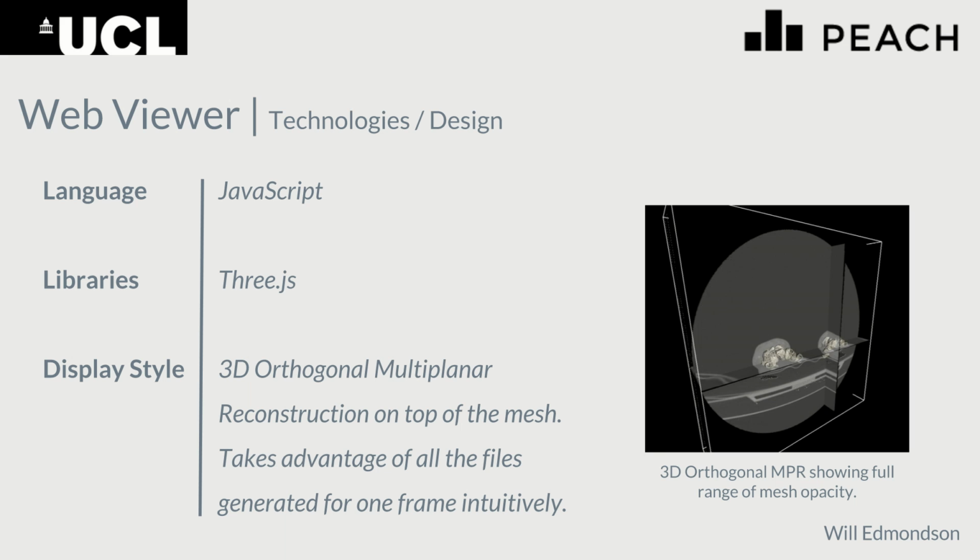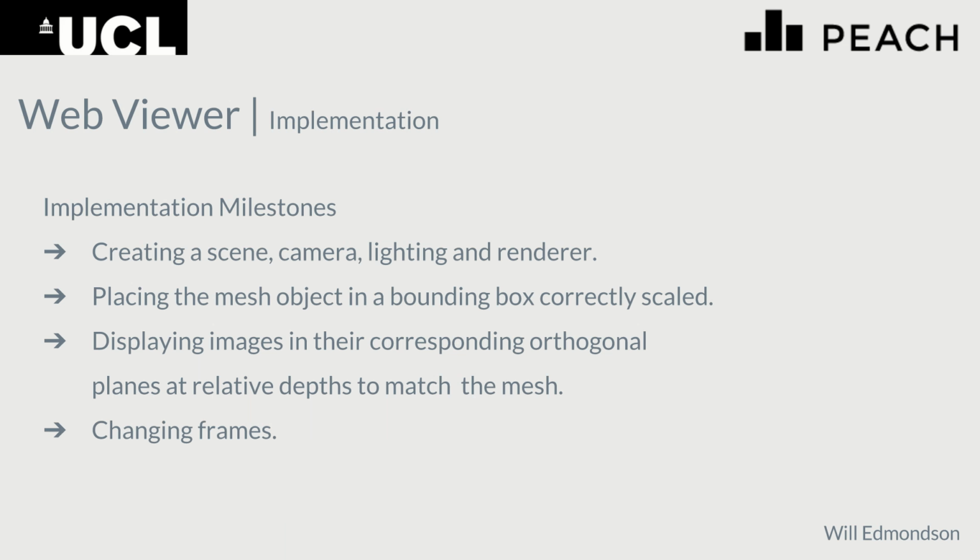The display style is slightly different from that of the HoloLens. It's 3D orthogonal multiplanar reconstruction. This shows the DICOM images above the produced mesh and takes advantage of all the files generated during the preprocessing section of the pipeline. A few implementation milestones: creating a scene, camera, and lighting to render the mesh objects within a bounding box, displaying the images in their corresponding orthogonal planes relative to the depth of the mesh, and then changing frames to give it a fluid four-dimensional view.